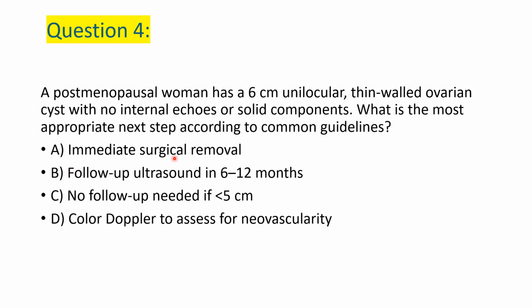A. Immediate surgical removal. B. Follow-up ultrasound in 6 to 12 months. C. No follow-up needed if less than 5 centimeters. D. Color Doppler to assess for neovascularity. So all these cysts, they should be followed up. So the correct answer is follow-up ultrasound in 6 to 12 months. So that's the recommendation that you have to give when you see such a cyst. Yes, postmenopausal, and it's non-cancerous, it's benign. So you just have to follow up in 6 to 12 months.